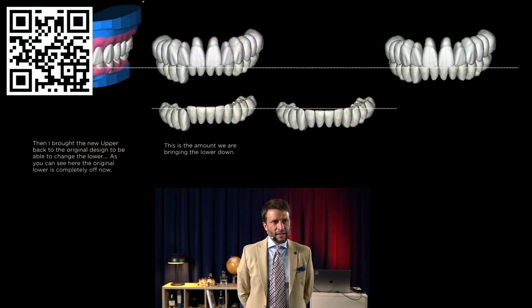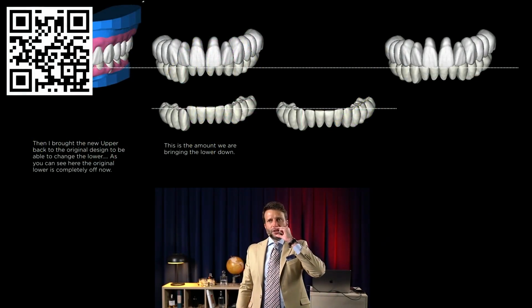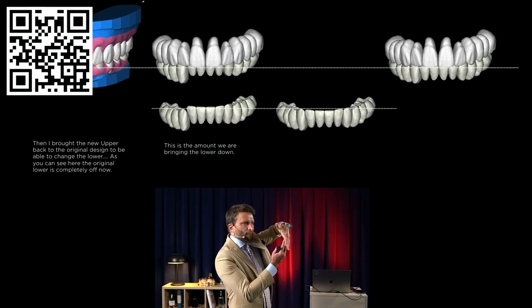Now, the story doesn't end here because we got a vertical dimension from the doctor, correct? We had the occlusion going there. Perfect.